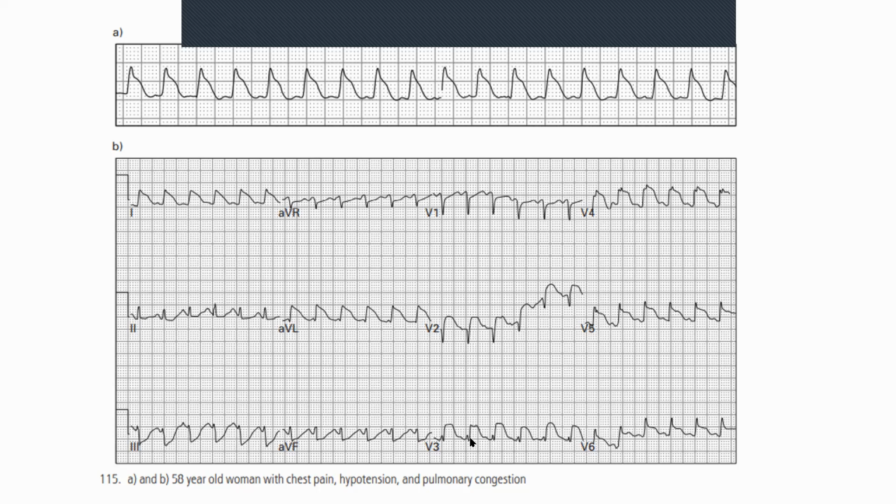But when you come to the anterior leads, V3, V4, you see more of what we call a tombstone. There are two reasons for it being called a tombstone. The first reason, of course, is that it looks like a tombstone. And unfortunately, once you see these, it also means that that's what your patient's probably going to have very soon. So those are the two reasons that we call them tombstones.